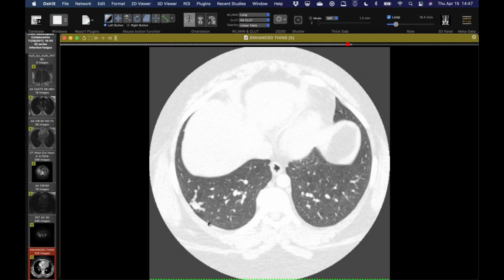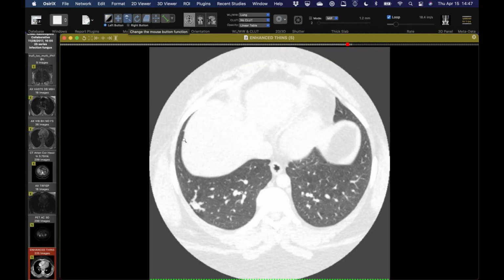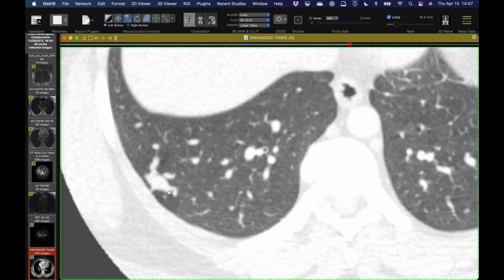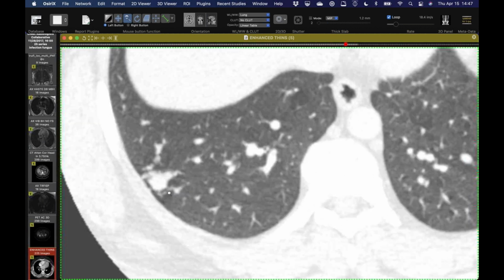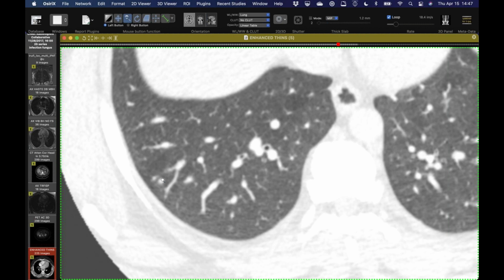Coxy are well-defined nodules, not smudgy centrilobular GGO things like this. Exactly. Okay, well, speaking of fungi, this was a consult I had today.